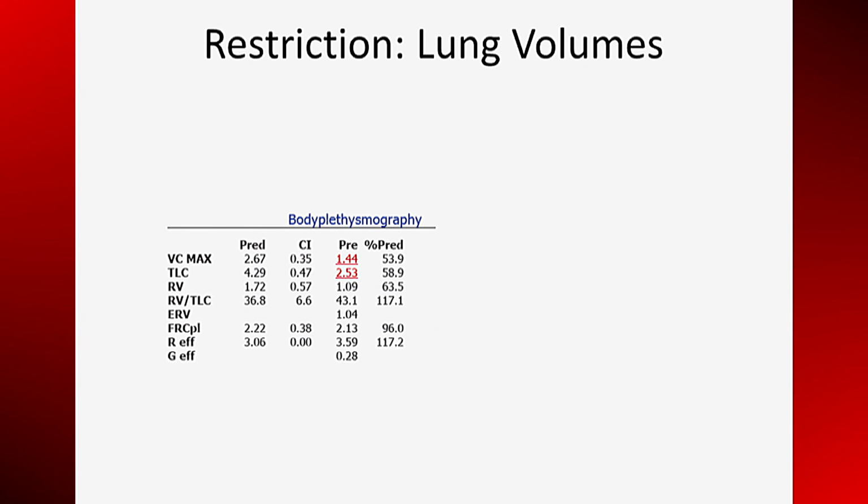One cannot diagnose restriction without a measurement of total lung capacity. The spirometry can suggest restriction, but lung volumes are required to confirm the suggestion. The total lung capacity is reduced. This is the definition of restriction.